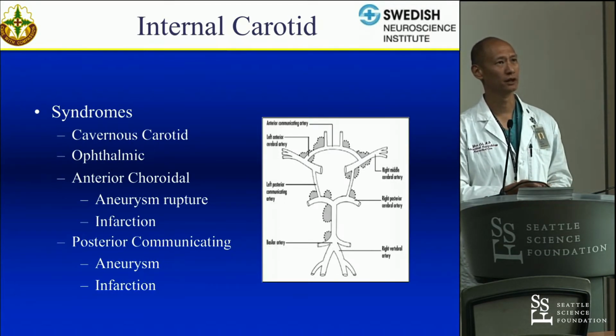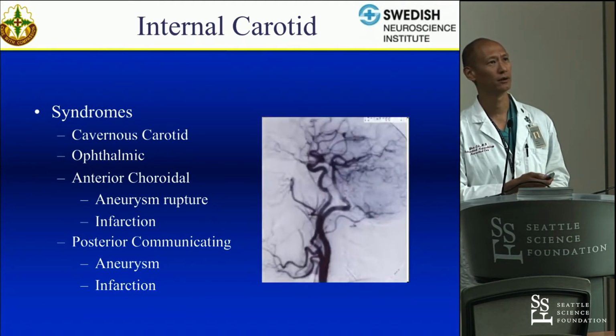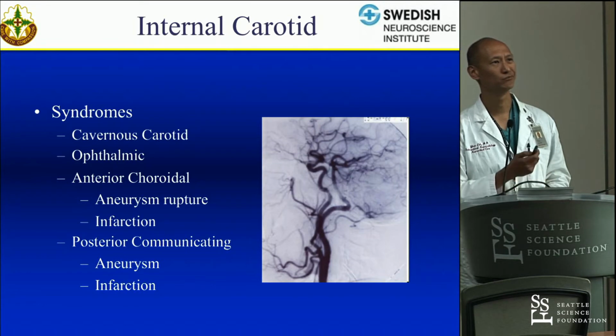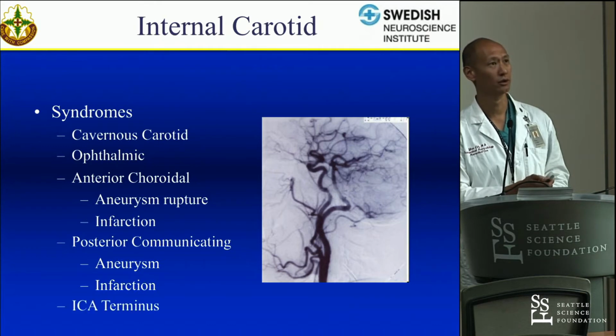It's a picture of the different locations of where we can find aneurysms. I'll kind of skip through that. We talked about the proatlantal arteries and the persistent arteries, so there's just a picture of a nice proatlantal.